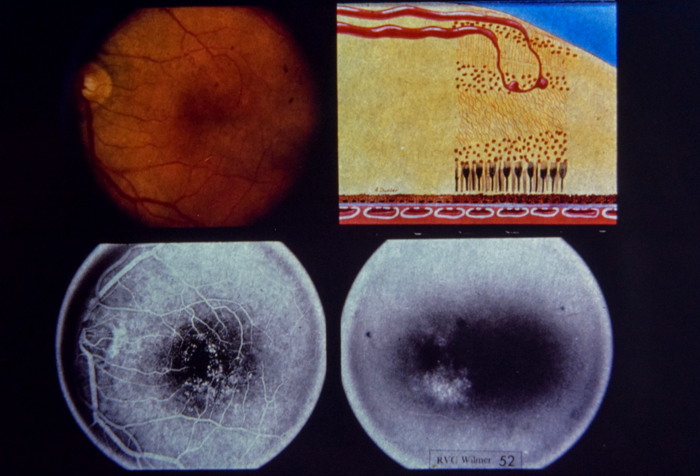Comment: this patient had reduced vision due to cystoid macular edema. Vascular abnormalities causing macular edema were clearly visible on the angiogram. He is a candidate for argon laser photocoagulation, the technique of which will be illustrated in slide 58.